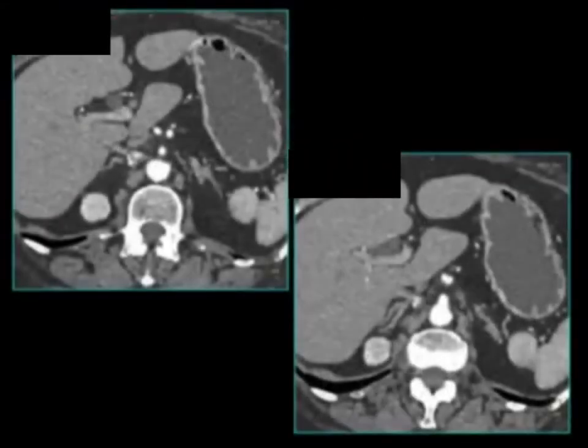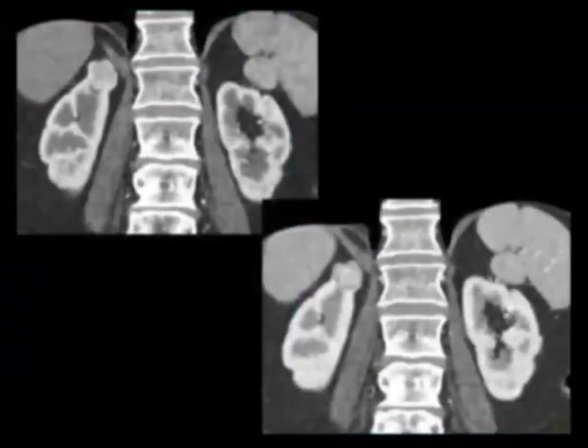Or this case where someone read this to be a normal kidney. The finding you're seeing in the upper pole of the right kidney was felt to be upper pole near the adrenal gland. And it indeed is upper pole, but it's an upper pole renal cell carcinoma. You see, things at the bottom or upper parts of organs like the kidneys, people tend to leave behind. Their eye doesn't quite track them correctly. Your eye tends to end where you want it to end.